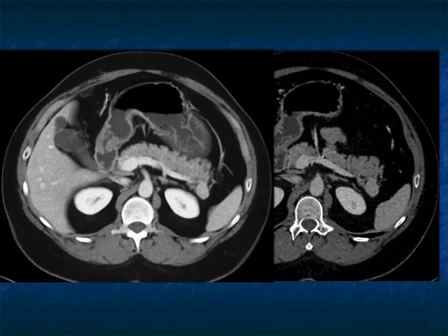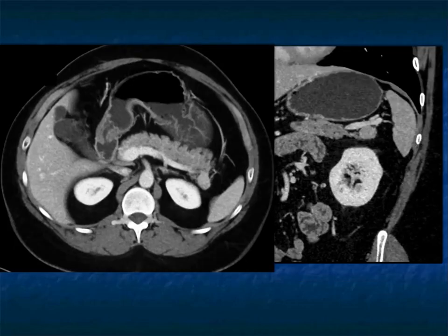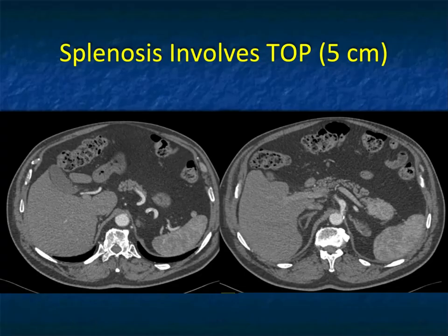Just a very nice appearance in that case, looking very, very similar. And here's just some additional delayed phase imaging. Here's another case. This is concerning. It's 5 cm. It kind of looks like maybe a pancreatic mass.